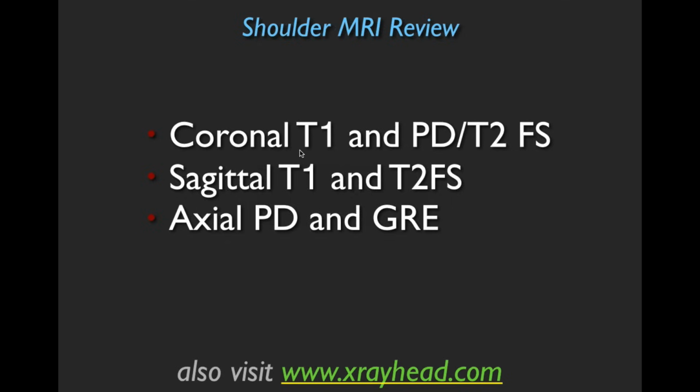At Stanford, we do coronal T1 and an intermediate proton density T2 weighted image with fat sat, sagittal T1 and T2 fat sat, and axial proton density and gradient echo images.